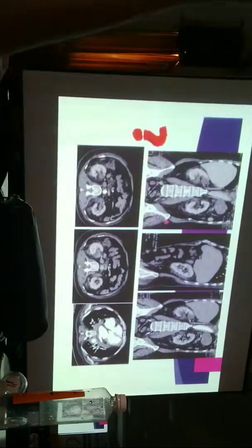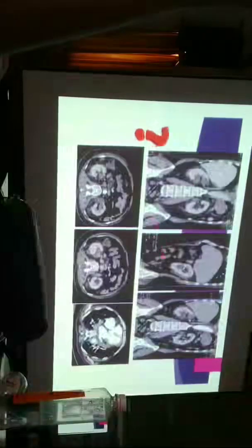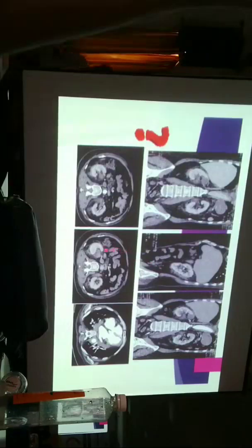So moving on to some other lesions, here you see a focal hypodense lesion in the kidney, which was a soft tissue density lesion. Besides that, what do you see? You also see bilateral perinephric soft tissue nodules, and in the chest of the same patient, you will see there is soft tissue thickening in the subcarinal region. So this was a case of lymphoma.